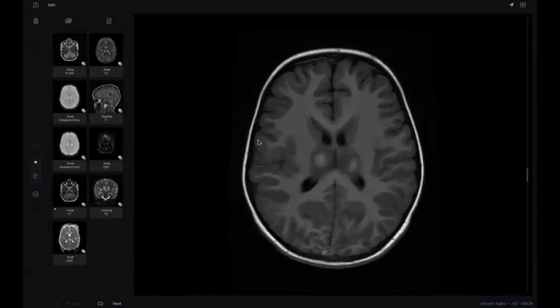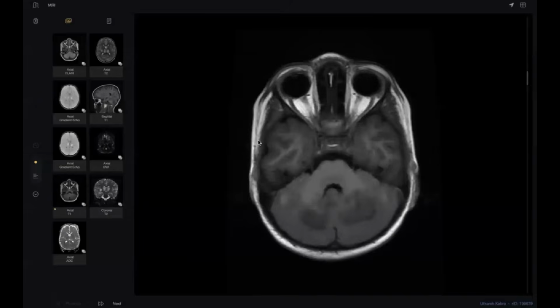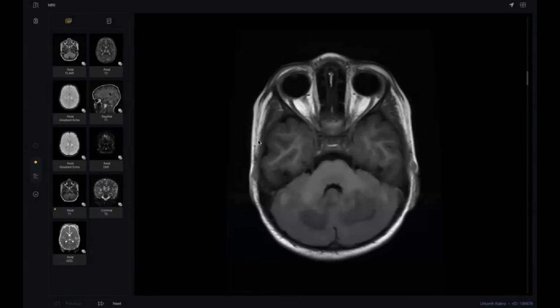Sir, it is involving bilateral basal ganglia, and it doesn't look like a vascular territory with well circumscribed focal hemorrhages. So I'm thinking that there might be some hemorrhagic conversion in the disease process involving the bilateral basal ganglia. I remember there are some variants of the demyelinating disease which may present with hemorrhage.